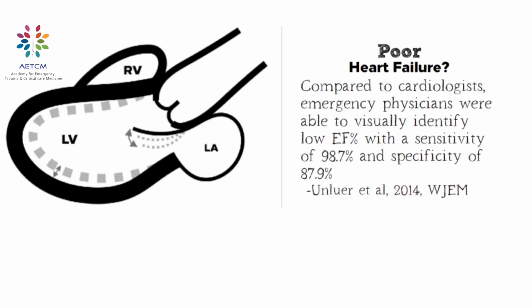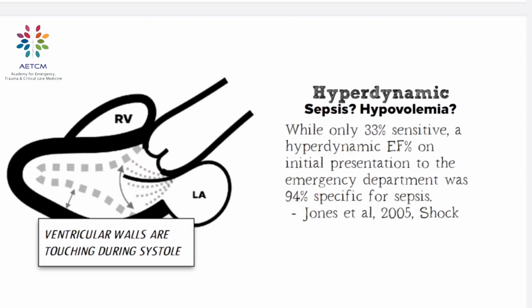Next, if you are looking at a very poor cardiac function, that is a patient whose heart is in heart failure, in the graphical representation I have shown that the contraction of the wall is very little, that is the walls of the ventricles do not approximate at all. This is how the motion of a poor heart will be visible in an echo.